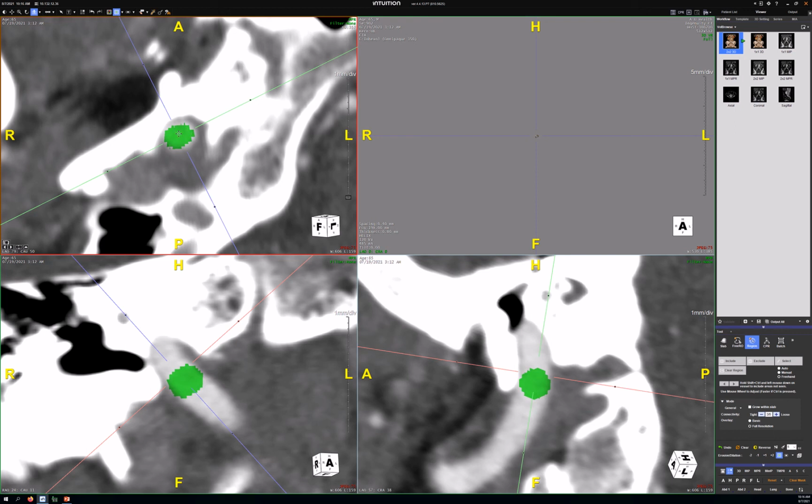Hold down Shift and make it a little smaller. One more, there, and then take it out to the periphery of the long axis. A little too far, you're picking up a voxel of fat. Go this way? Yeah, perfect. Right there. And then the other direction, it doesn't look like you need to cover anything, but remember the circle is coming in and out of the plane, so do it anyway.